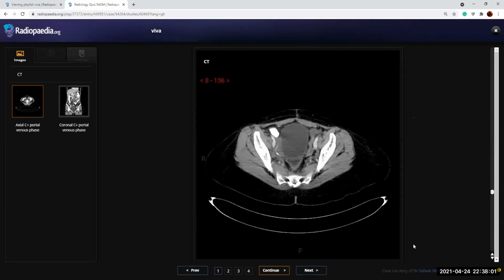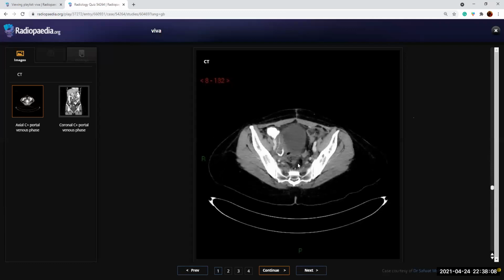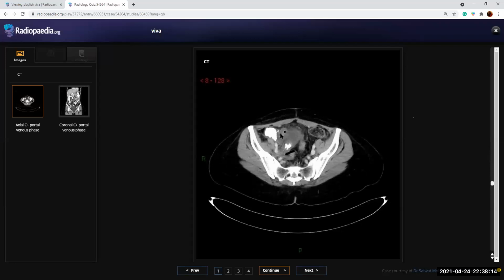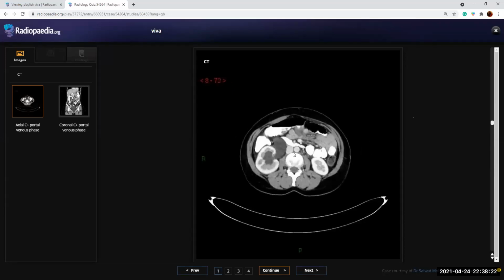I can understand. This will be the last case, Dr. Avni. Thank you. So, Leila, you were right. There was a malignancy, so they have removed the uterus, but they've given radiation, and this is radiation enteritis. So actually, if you look closely, you're seeing it even in the sigmoid colon. It is because you've seen it up here.